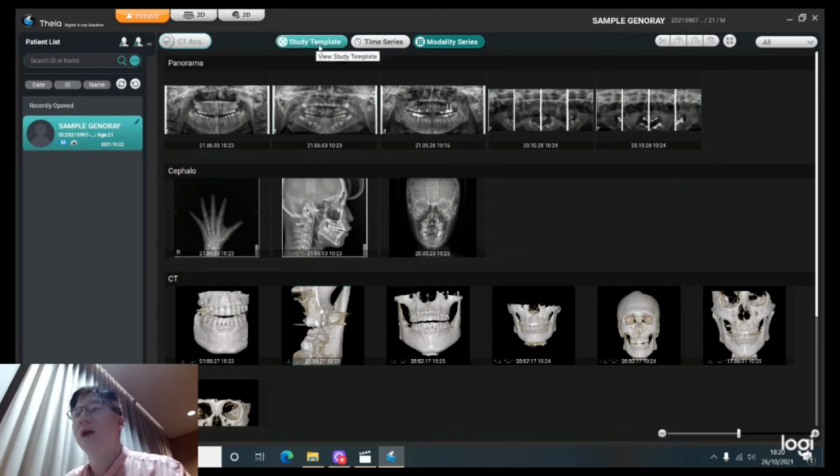Yeah. And this is one of the differences straight out of the door compared to Triana, where in Triana you had to click each file to preview them. There was no such kind of preview like this where you can see it all at once. So this is way more convenient compared to Triana.